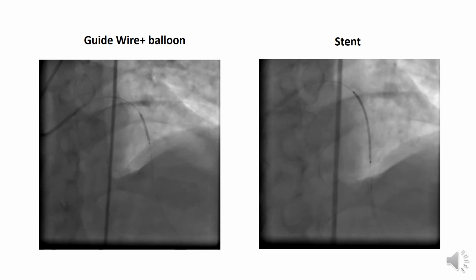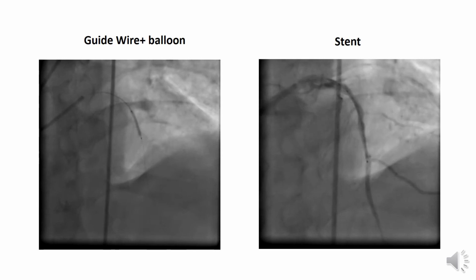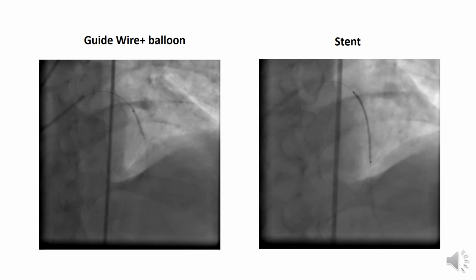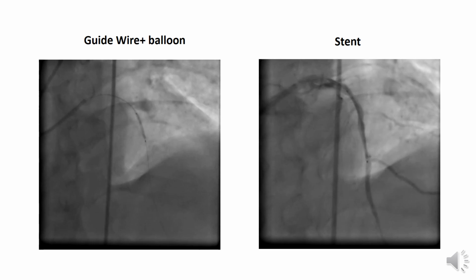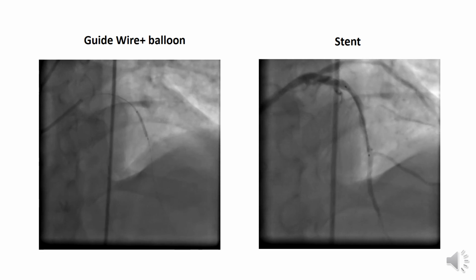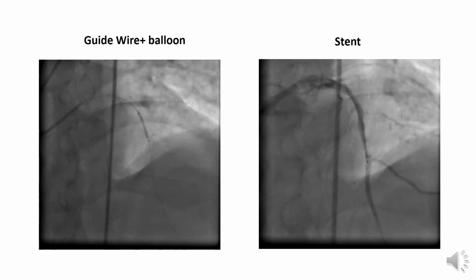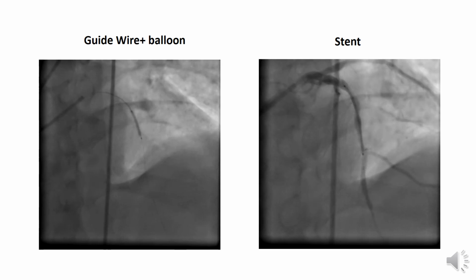In this picture we see a stent, which has a denser, more radiopaque meshwork like we see here, and it has 2 radiopaque markers for accurate detection of the location of the implantation site.